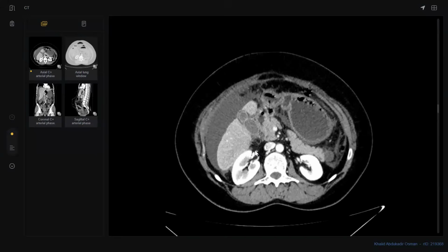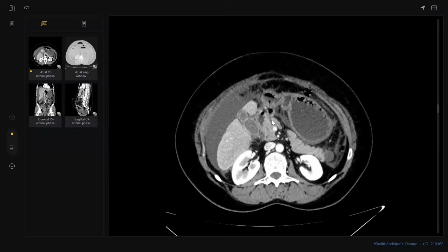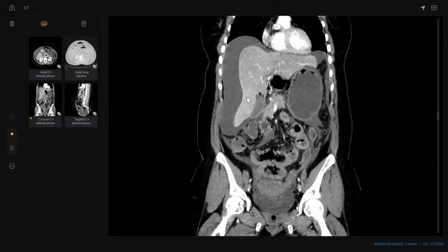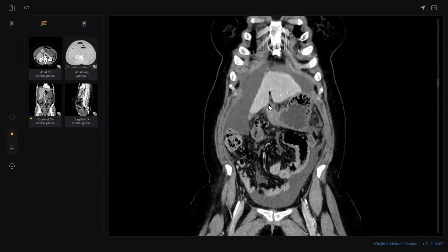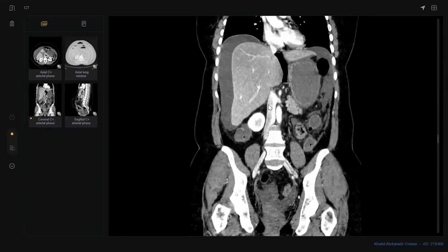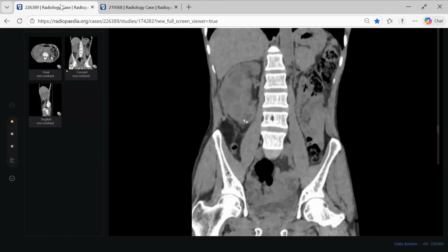Thank you. What happened here? We suspect at this area, which is the pylorus or the duodenal cavity. It's better to include both if you are not sure, because almost the perforation site is at the first part of the duodenum, what is called the duodenal cap, which you see here. Okay. As usual, there is a large amount of free fluid and intraperitoneal gas, pneumoperitoneum. The case is an emergency. Thank you, doctor, so much.